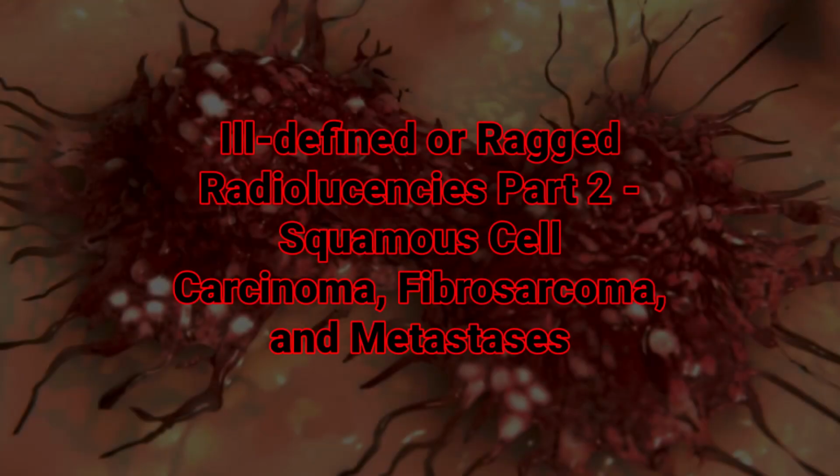This is part 2 of ill-defined radiolucencies, or how to identify malignancies in oral radiology. This video is going to cover squamous cell carcinoma, fibrosarcoma, and metastases. So I'll get right to it.